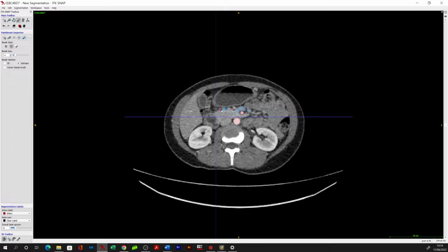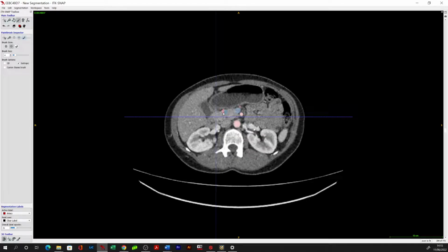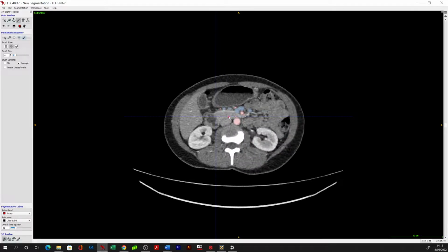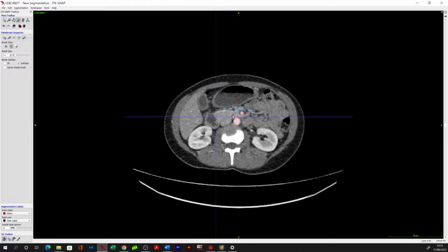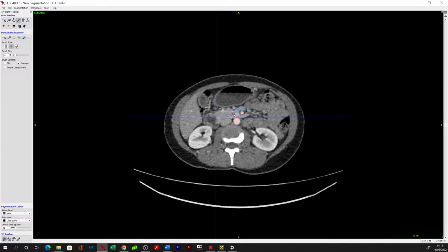And you can see here, there's a little flash of something that, if you follow it back, is going to the gastroduodenal artery. So this will likely be a pancreaticoduodenal artery, as opposed to anything that we want to segment for our case that would be relevant. So I think we can be confident there's maybe something coming into the SMV here.